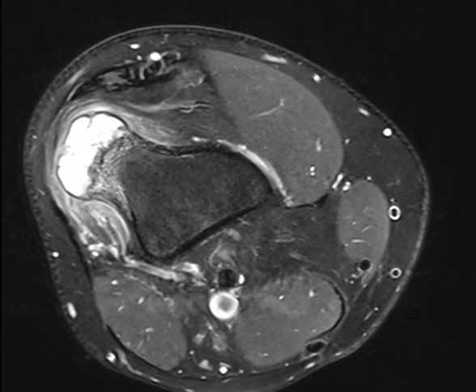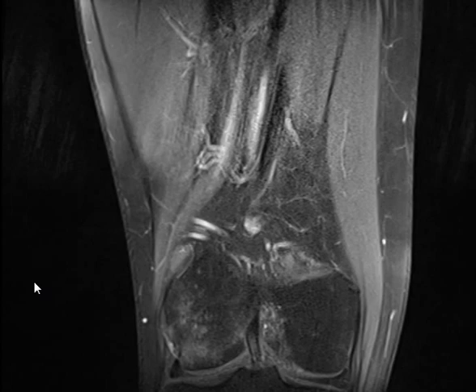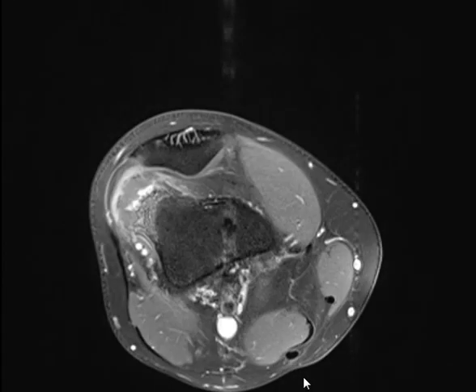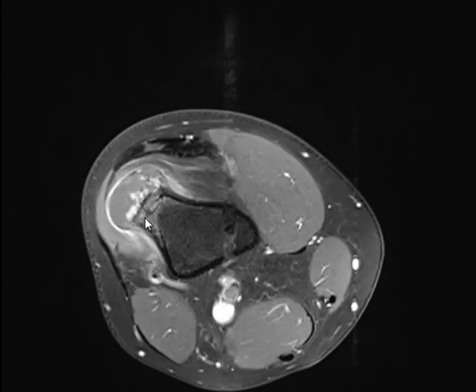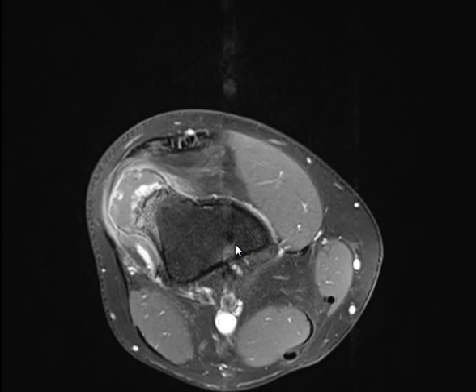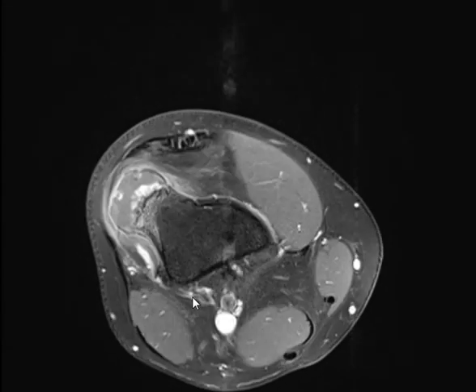T1 axial, it's written there. Okay, this is contrast, no problem, and the axial is better I think. So what do you think? Enhancing with irregularity is very suspicious for chondrosarcoma. And if we link it with the clinical history of a swelling that is starting to enlarge and getting a little bit painful, it's very suggestive of malignant transformation of osteochondroma into chondrosarcoma. Okay, so you have to keep that in mind.